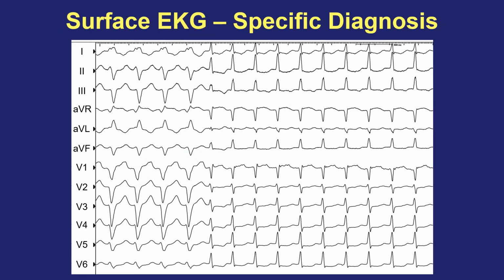But not only mid-tachycardia does the QRS width and morphology change, but on top of that, in this example, the cycle length changes as well. On the left, you have a longer cycle length, which means that it's slower at 167 beats per minute. And as the tachycardia QRS narrows, the tachycardia accelerates up to 188 beats per minute or 320 millisecond cycle length.